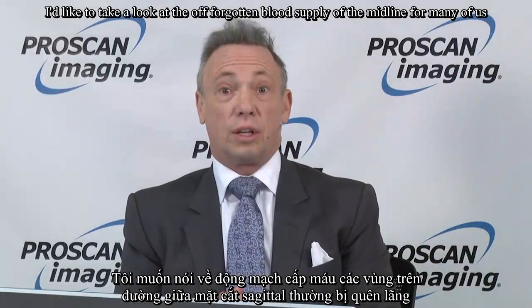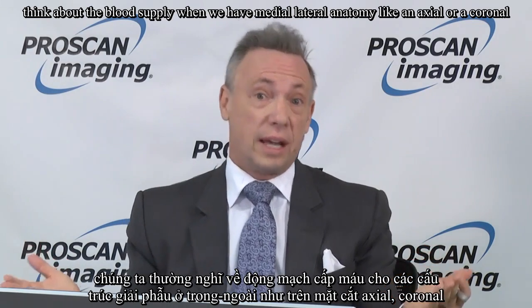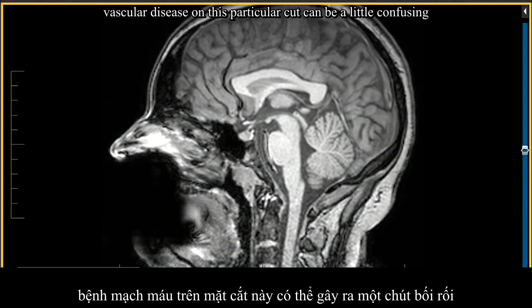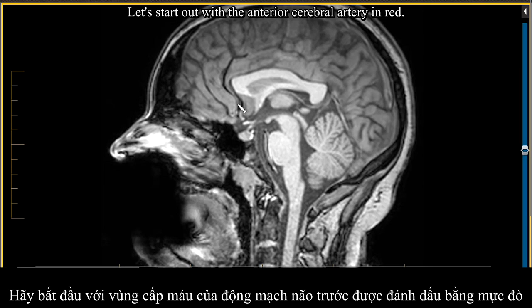I'd like to take a look at the oft-forgotten blood supply of the midline. For many of us, we think about the blood supply when we have medial lateral anatomy, like an axial or a coronal. But we see so many of these, and vascular disease on this particular cut can be a little confusing. By the way, pay no attention to this little finger-like projection, which is just volume averaging of a gyrus in the inferior frontal region. Let's start out with the anterior cerebral artery in red.